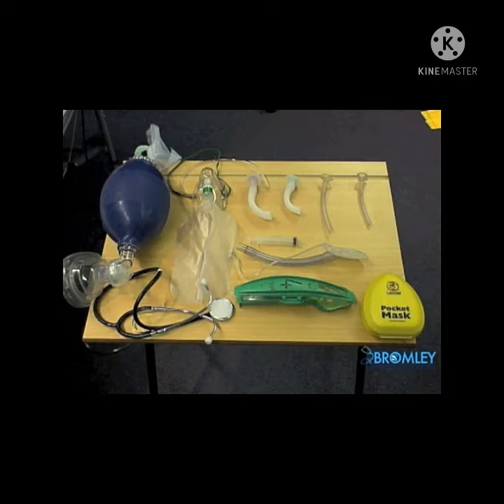This procedure video will revise the importance of assessing an airway, utilizing appropriate airway maneuvers, using appropriate airway adjuncts, and then assessing when a definitive airway may be required. Take some time to familiarize yourself with all the equipment shown here. These are the likely things that you would be asked to demonstrate to a medical student and the things that you would be expected to be able to utilize in an arrest situation.